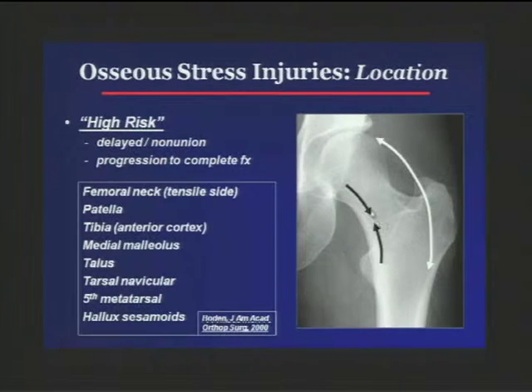On the inside, it's compressive, okay? And so most stress fractures of the hip are down in this basicervical medial neck, and they do just fine because every time they take a step, it's pushing the fracture together. If you happen to see a developing lucency or stress fracture, a little sclerosis, something up here, that deserves a phone call because under tension, that can easily displace with weight bearing, and so those are the dangerous ones on the lateral side.